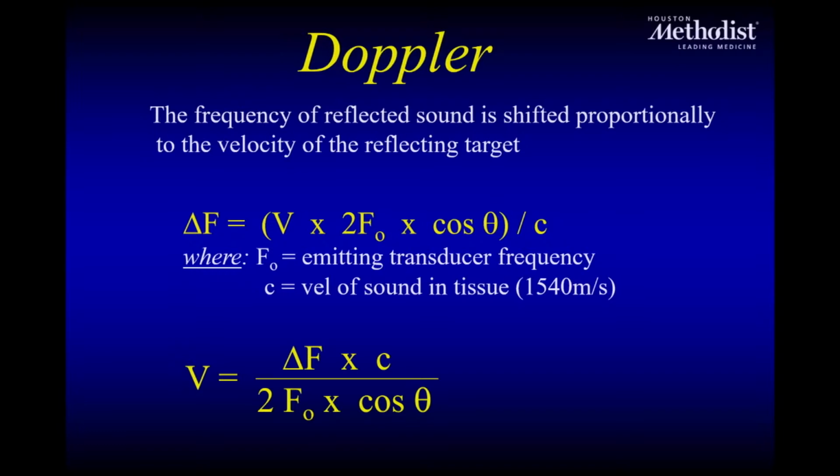And most of the time here, it's either blood in the cavity, and more, as of late, muscle and tissue Doppler. So in the past, the echo machines used to display the change in frequency, and you had to kind of convert it, if you will.